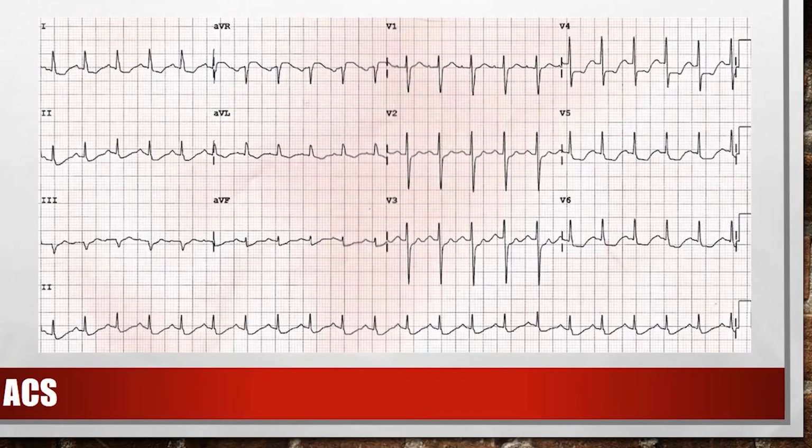All right. So here is another EKG. This is designed to show you a left main heart attack. Note that there is ST depression everywhere. Inferior territory, check. High lateral, check. Lateral, check. Anterior, check. Everything has ischemic changes, and here's the key, when you go to look at AVR in this one, all the way up. Call the cath lab. You got a problem. Okay?